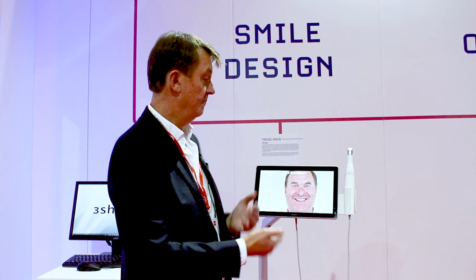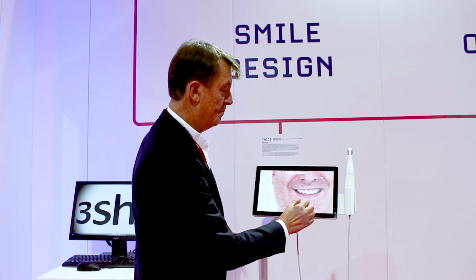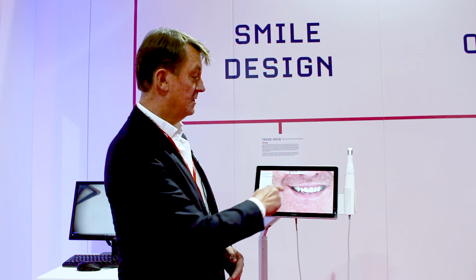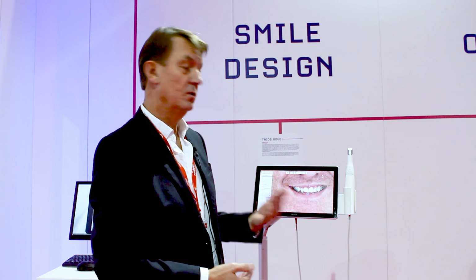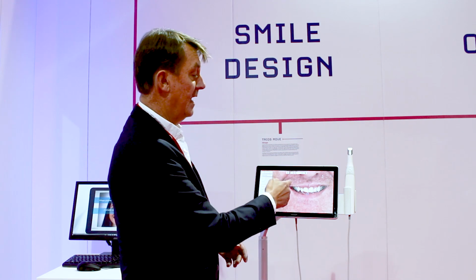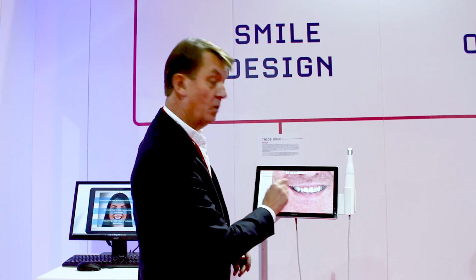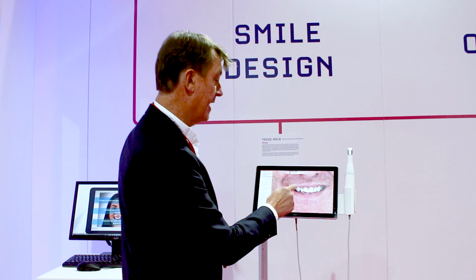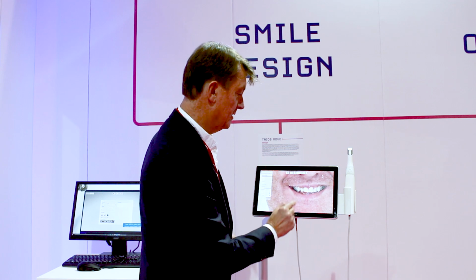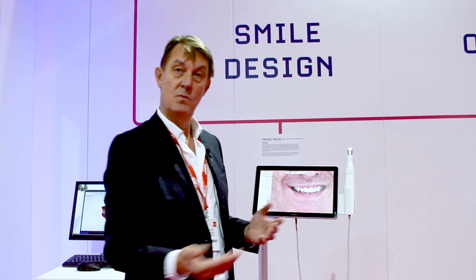So when we move forward, very simple to use, simple system. We've already got tooth form based on the information that we have with the intraoral scan. This gives us the opportunity to see the outline of the teeth and how they will show for the patient. You can see the difference in the wear of the tooth and the form. It's possible to move these teeth individually, so if you want to make one slightly longer or slightly smaller, you can do, just by moving that up or back down into position. And that's quite simple to use, so that explains to the patient what you're doing.